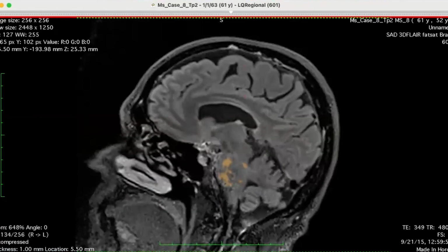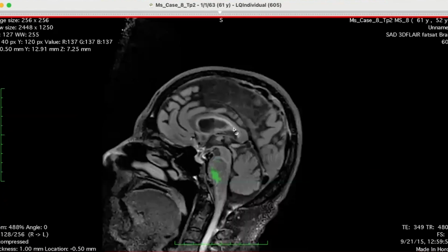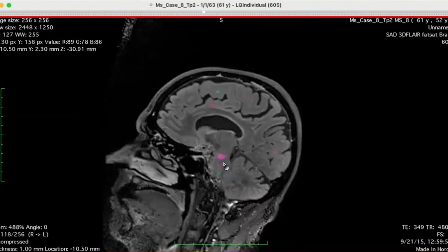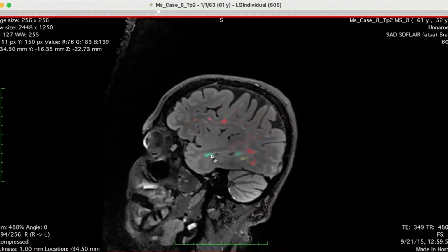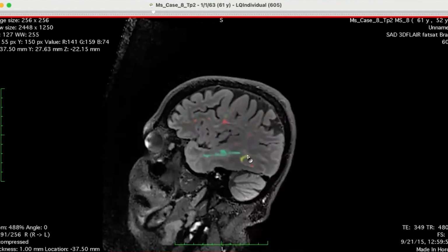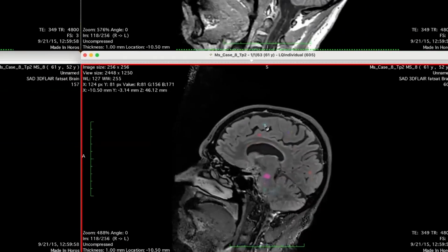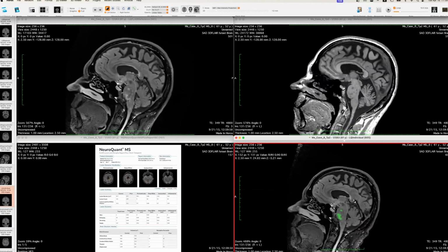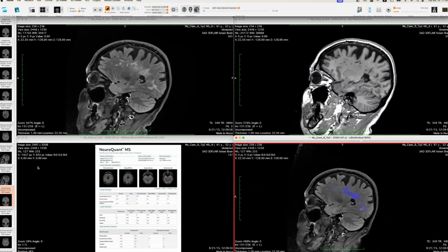We also produce some other segmentation outputs as well. So this is the lesions stratified by region and color-coded. We also do produce, as I will showcase here, the lesions segmented where each lesion is given a separate color. So you can see here in turquoise, one lesion, lighter green, another lesion. We have this big periventricular confluent lesion here, another lesion here. So this is a useful map just to showcase which lesions, the individualized lesions, and having a color code map for those.